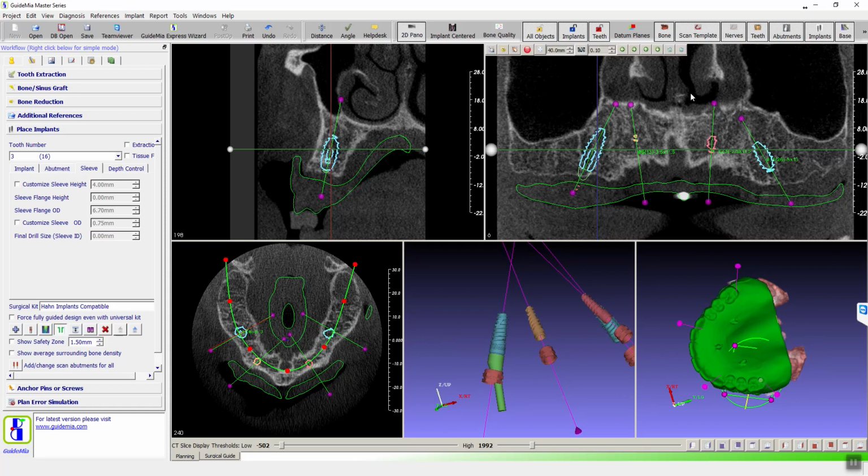For this case, let's say for 4 of the implants, instead of following the surgical kit, we want to say, hey, I only want 2 millimeter holes for everything. That's project level control. We can do this by changing implants one by one, or we can have an option at the surgical guide design time.